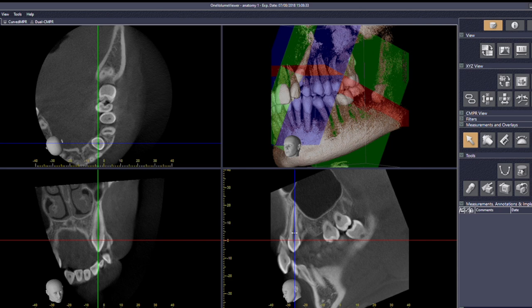If you want to get an even prettier picture without the coloured lines, let's come back to the view box. We already did histogram before, which was this one that took the histogram on and off, but next door to it there's this button, which says show or hide the positioning cursors. If you click that, you'll see it gets rid of the coloured lines. Now the ends of them are still present, and if you hover over here where they would be and click, they come back instantly.